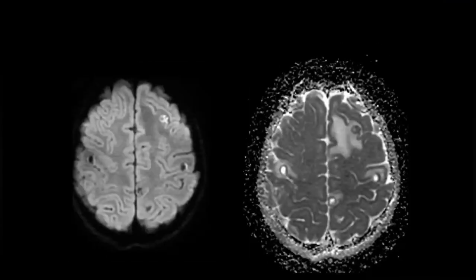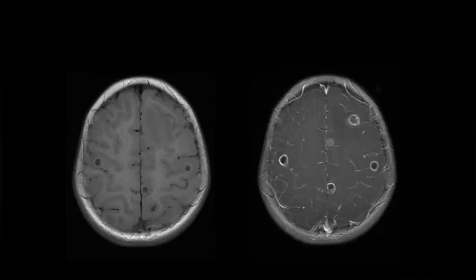So there are two very particular points here which you can pinpoint to one diagnosis. What do you think? So demyelinating lesions, as these are at different times. Have you seen demyelinating lesions, multiple ring enhancing? Usually they are, what kind of ring enhancement do they have? So they have incomplete ring enhancement. So what about these? These are complete ring enhancement. So the other differential is toxoplasmosis. Okay. So you gave all the pertinent findings, you mentioned all the diagnoses. These two features, that there is an eccentric enhancement, yes, and the stages are different.